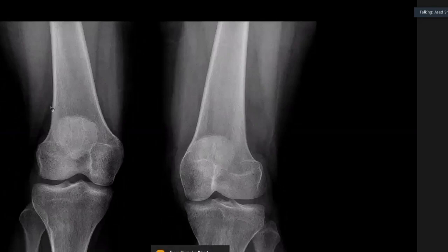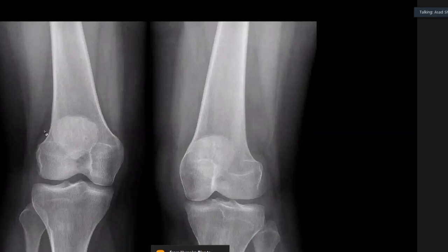Okay. So if you look at this fat pad here, this line in the right knee, what's happening is that it has lost the line in that area, and there is a soft tissue density area which is causing uplifting of that fat pad, and it is extending upward. It is also causing slight endosteal scalloping of the bone.